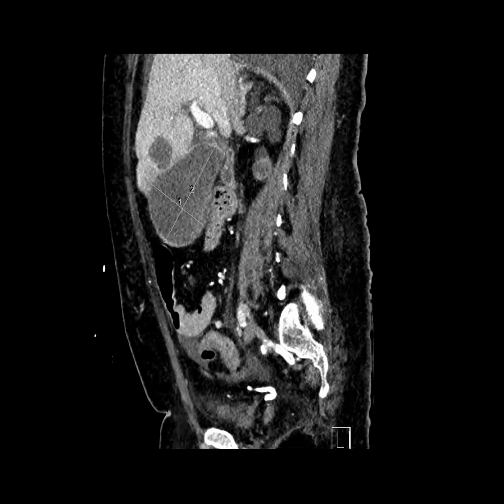So Aarti, I have a question. You call them bilomas. Are they bilomas or are they intrahepatic abscesses? Well, I think of those as the same. I see it as a ruptured gallbladder into the liver, and it could be infected or it could be just bile. It's kind of like the same thing as acute cholecystitis. At some point it becomes infected, right? What do you think?